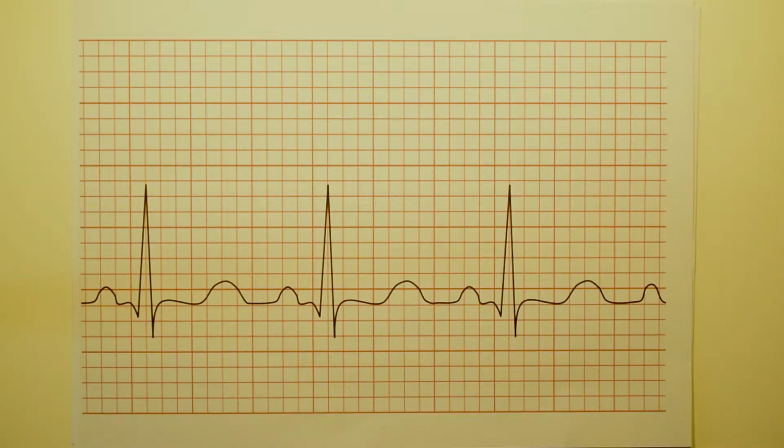Today we're going to continue with ECGs. If you haven't watched my previous video, I'd recommend you go check it out, because if you're not quite sure what's going on on this page, the PQRST and all that sort of thing, it'd probably be best that you jump back there quickly. But if you have watched that, let's get going.